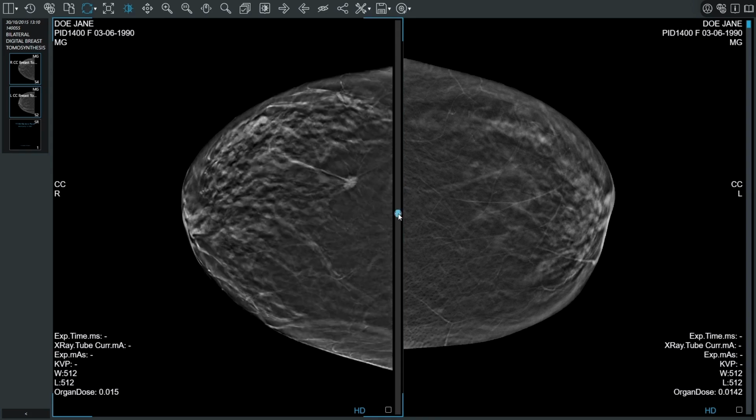By default, the overlaid graphical annotations are hidden. To display them, click the Show Annotations button in the toolbar, or press the configured key binding, which is set to the G key by default.